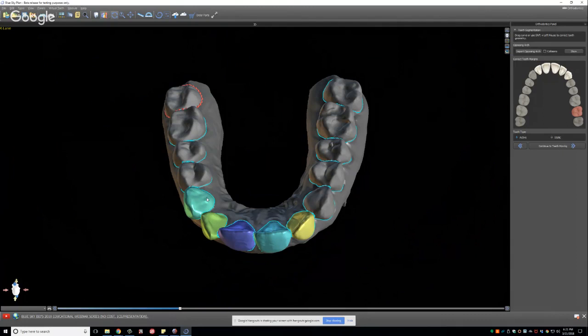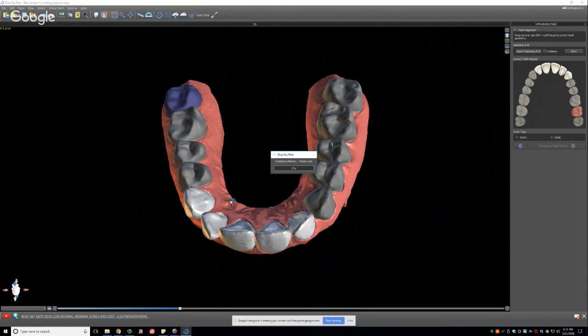And that was also the step when I would typically go grab a cup of coffee. Okay, so one of the first things that you won't see on my desktop, my computer pop up, because I've already given it the okay. I've already defined this one parameter. Once this is done initializing, I will show you this.